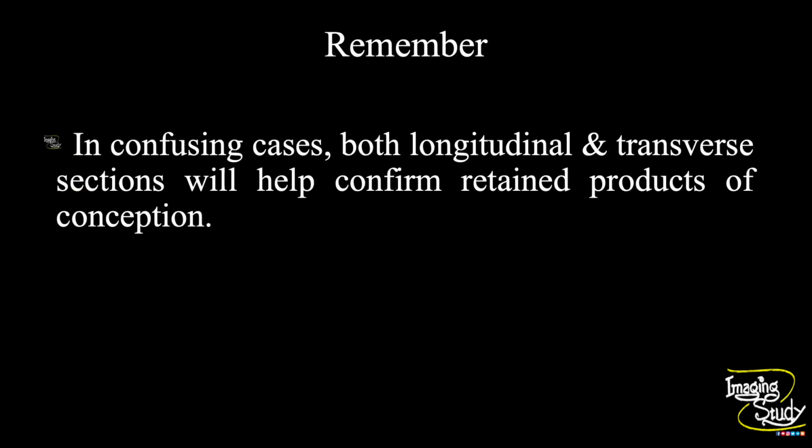Now the take-home message. In confusing cases, both longitudinal and transverse sections will help confirm retained products of conception.